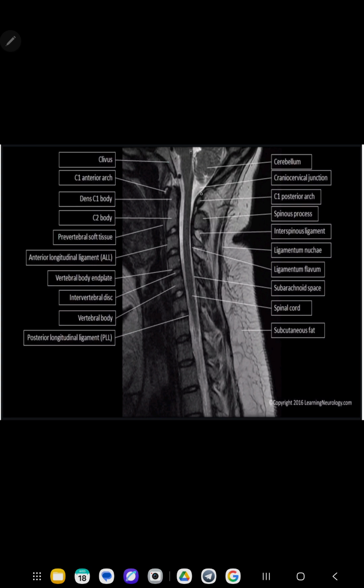Now like that, from the posterior arch to the occiput is the posterior atlanto-occipital membrane. So behind the transverse ligament you have the posterior longitudinal ligament extending above, that is the membrana tectoria. Now the spinous process: the supraspinous ligament has a cephalic extension called the ligamentum nuchae, and in front of the lamina of the vertebra is the ligamentum flavum.